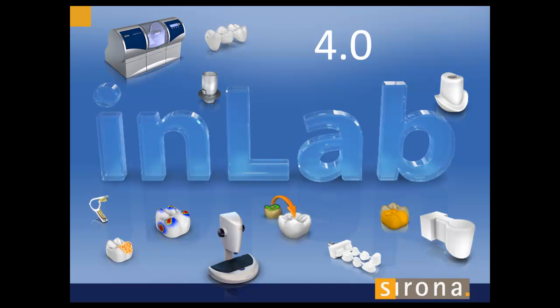I'm very excited that it's finally here, and it was definitely worth the wait. This software has completely changed the way our lab is operated. We now have the ability to design multiple restorations at the same time, in both arches and in any design mode you want. The new software has a completely new look, great new features, and some powerful tools. There's really almost nothing that this software can't do.